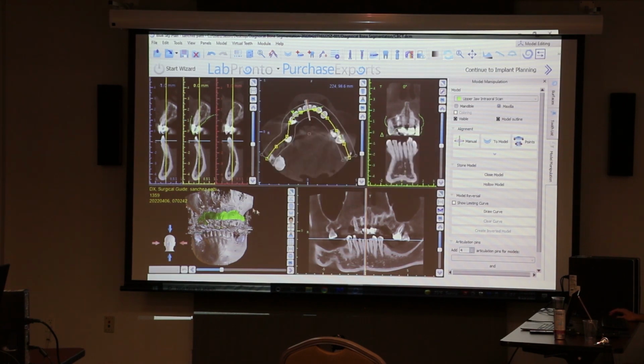And so if we were to look at this thing, first off, we can see all the scatter. I hate looking at these things because you just get this scatter everywhere. They're just not very pleasant to look at. But the very first thing is I'm going to look up here, and I'm going to look at it here, and I'm going to go, okay, it's pretty close. You don't want to skip this part because this one does get off, and I'll show you why.